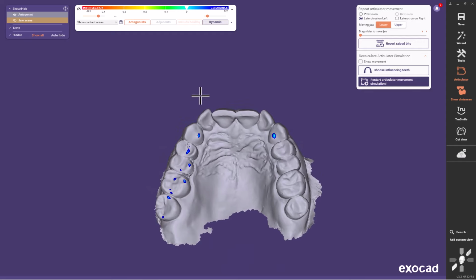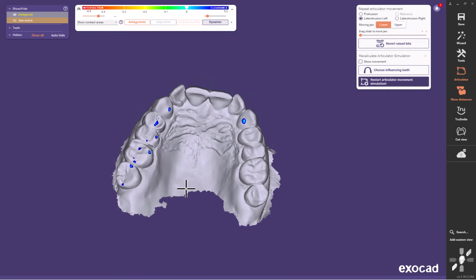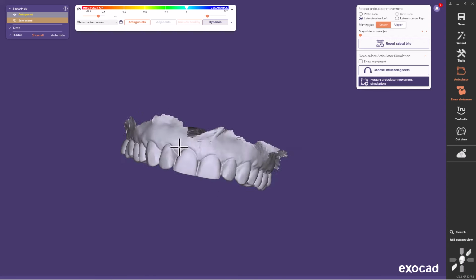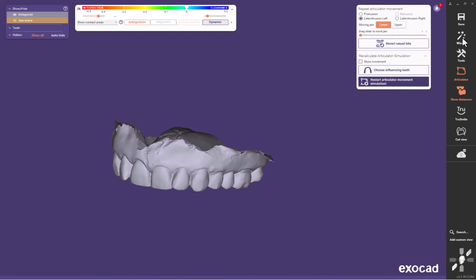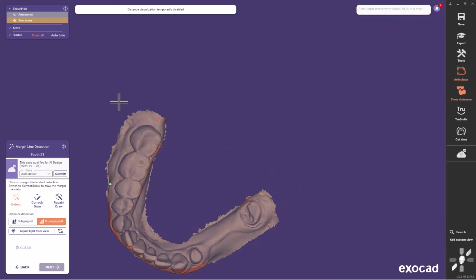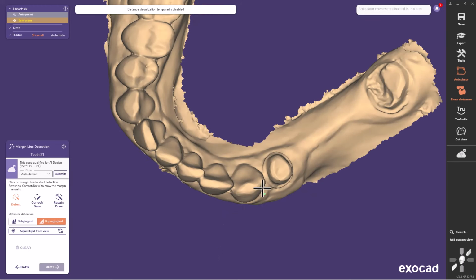So I feel very comfortable in recommending a couple crowns for these front two teeth, because now I would have from centric relation, which is right here, she's got contacts on her cuspids, and when she moves forward, right, and left, she's not rubbing on back teeth. Now all I have to do is set teeth over here for these three teeth, and I've got my wax up completed.